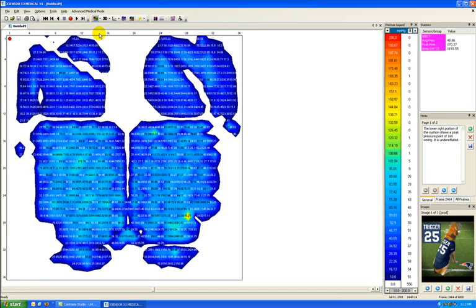That is, I can go to a diagram that shows me the pressure image data that's recorded for each cell on my sensor. So I can tell, as an example, that on that pressure point on the right side of my body we saw pressure of 170.27 millimeters of mercury, or that on the front of my right thigh we had a pressure point of 36.16 millimeters of mercury. So I'm able to actually see the data that's recorded for each sensor.